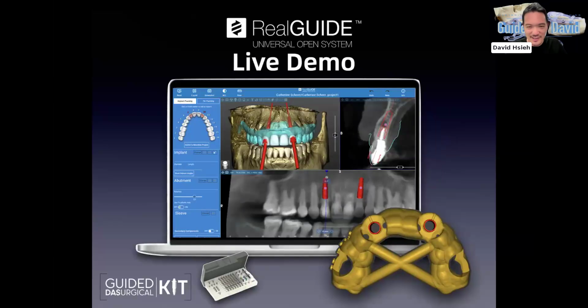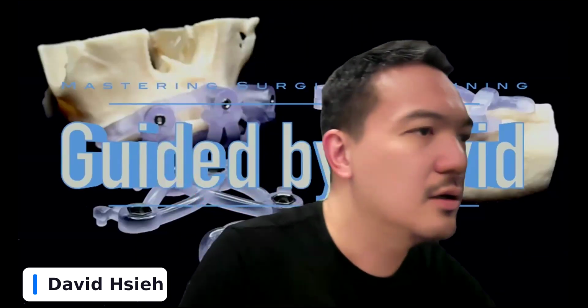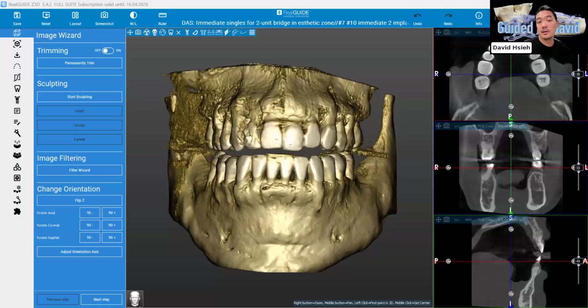So let's get started. We're going to do a live demo here. Let me go ahead, stop sharing my screen from here, and I'm starting. Okay, and I'm going to share my screen from my designing software. All right, there we go. Welcome to my world.